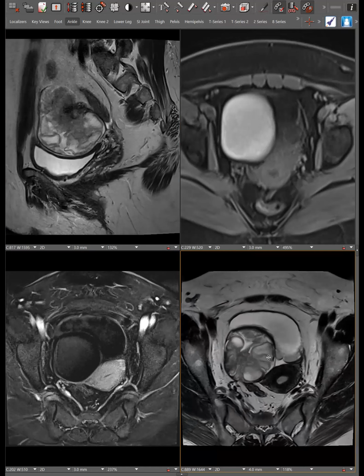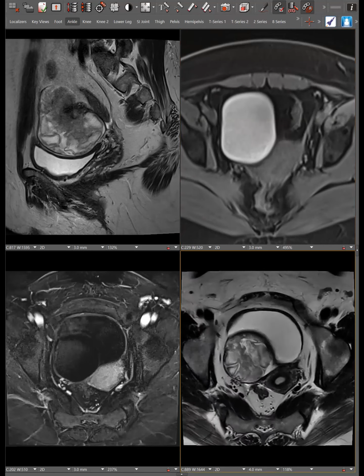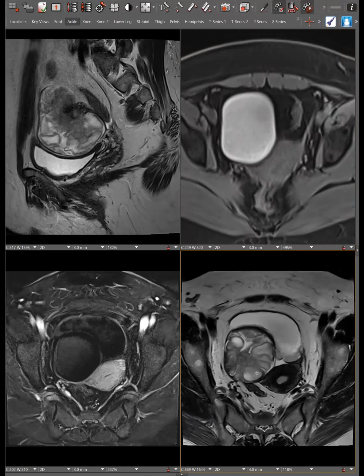This spoke wheel pattern of ovarian follicles is the clue, because endometriomas should have T2 shading, but not discrete follicles in them. This is too nice a pattern for this to be an endometrioma. They took the patient to surgery about 3 days after this MRI, and it was a necrotic torsed right ovary. It was enlarged because the increase in volume from hyperstimulation predisposes these ovaries to torsion.